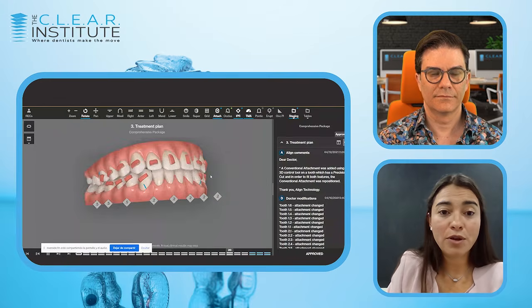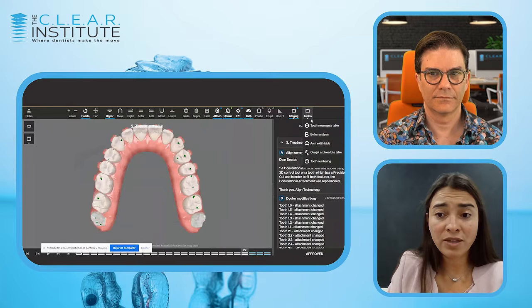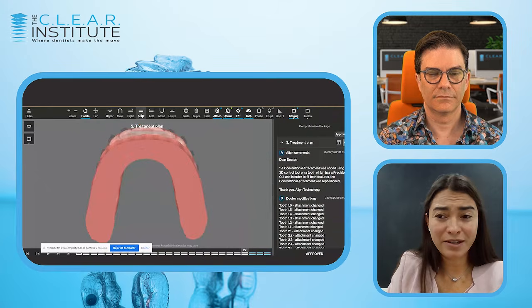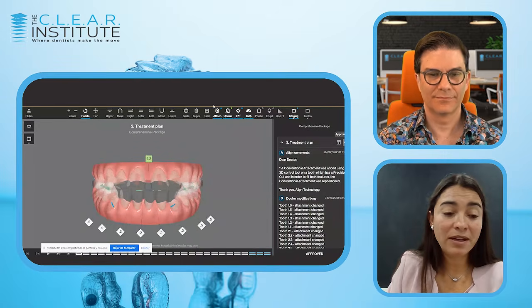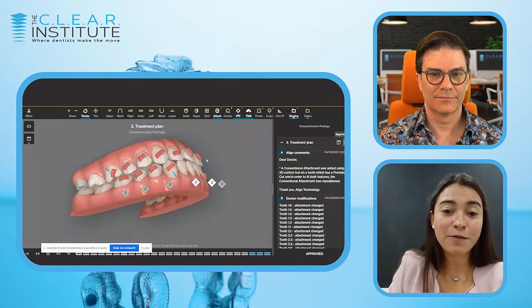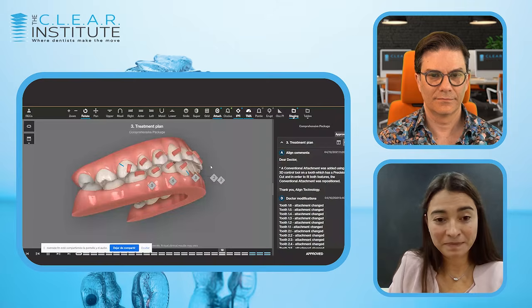There is no contact on the anterior teeth, and we are actually getting 3 millimeters of overjet. These 3 millimeters of overjet are only on the computer and the initial completion of the case, probably. But down the years, we have some safe overjet for this young man to keep growing, right?